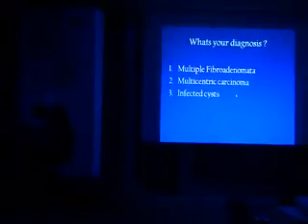Who would go for the first diagnosis? Fibroadenoma. 1, 2, 3, 4, no cheating. 3, 4, okay. Multiple or multicentric carcinoma. 1, maybe 2. Okay, infected cysts. 1, 2, infected cysts. Okay, I'll start with number 3.